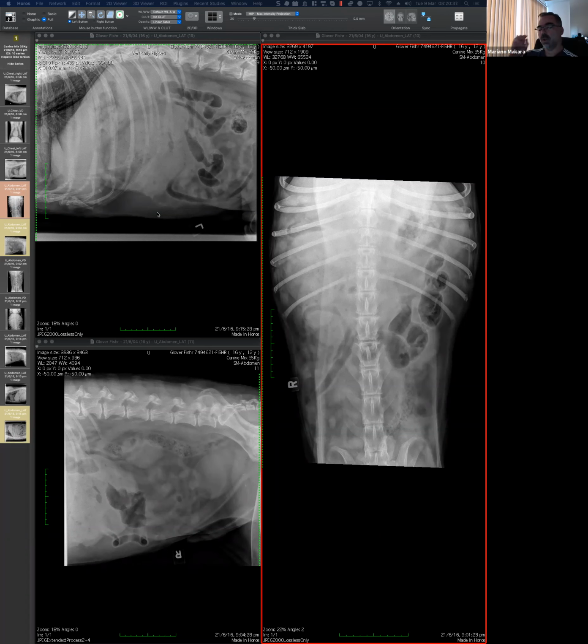Okay, good. So you identify something you described. You already offer, I suppose, three options, as far as I could recall. So one option is that it's small bowel. And if that is the case, then I suppose you are concerned because there are two populations. The other option that you considered is colon, and the reason why it looks atypical is basically that what is abnormal at the end of the day is the location. And for that, I have the explanation that there may be a mass displacing the colon. So that's the second option.